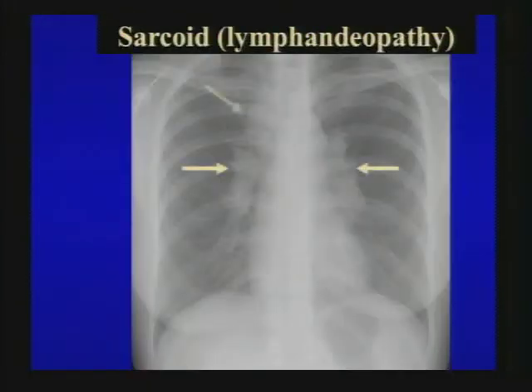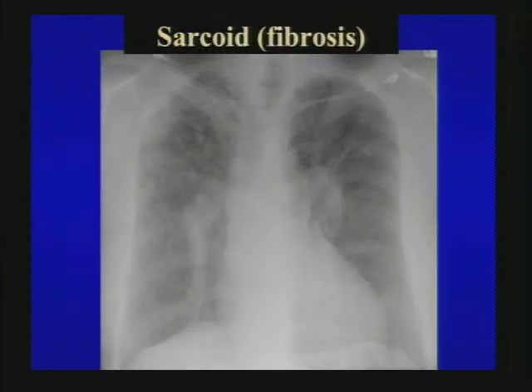Lymphadenopathy we talked about already. Usually very symmetric, hilar predominant lymphadenopathy. Also, young, relatively asymptomatic patient. Almost all of those who have perfectly symmetric hilar adenopathy have sarcoid. Remember that sarcoid also can produce fibrosis, which tends to be strongly upper lobe predominant.